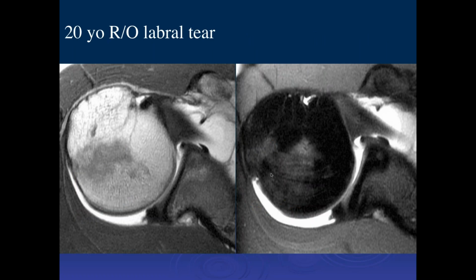Okay. What do you think of this one, Sam? A question of a labral tear. Posterior labrum is a little bit blunted. The anterior labrum is really small.